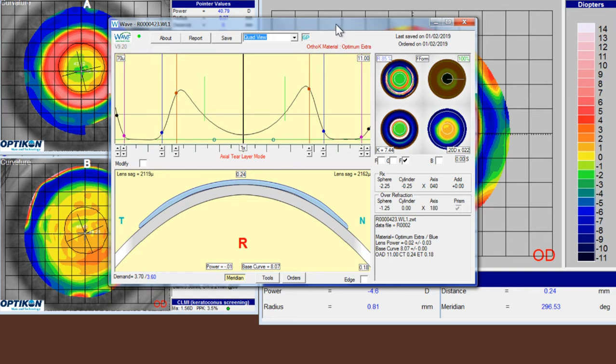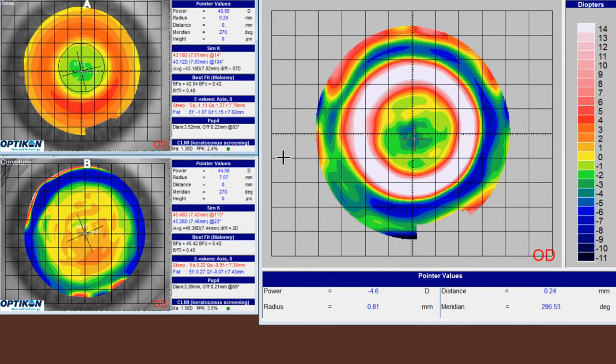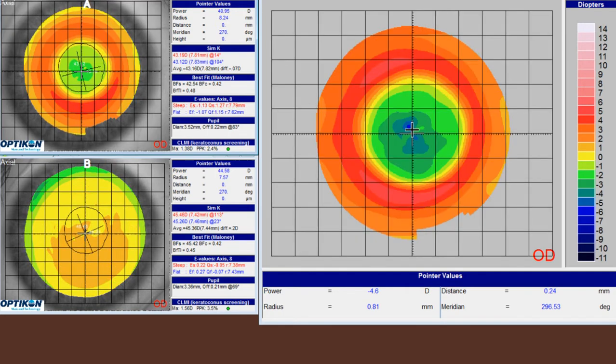What is a little bit more unusual is that this patient with the lens off refracts at about a plus 2. And so if we look at the baseline refractive error, it's about a minus 2.25. And if we go back to the difference map, we'll switch to axial mode so we can look at refractive power changes, and we can see at this apex we're getting about a 4 diopter flattening. So it is approximately double the patient's refractive error. And so this part kind of correlates too.